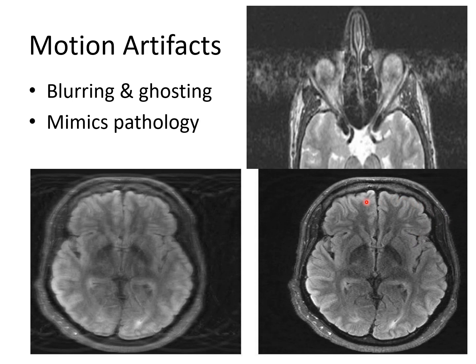In this image the motion artifact is corrected and we can clearly see the brain parenchyma. So this can mimic pathology or obscure pathology. To avoid this, always correlate with other sequences.